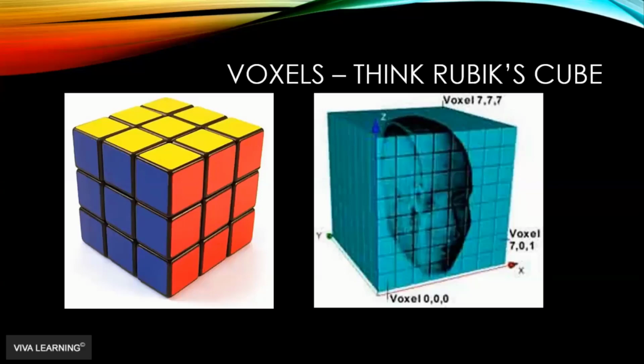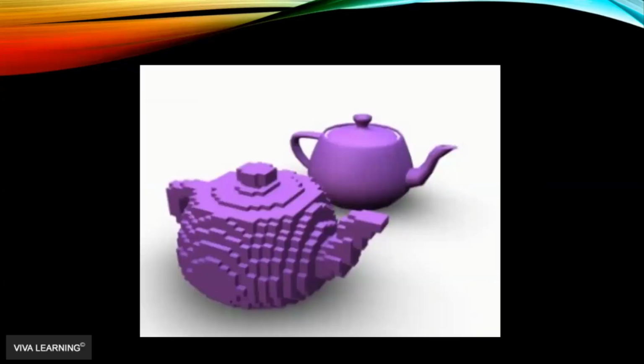And so when we see the CBCT volume, it's a compilation of all of these different cubes, which in turn relates to what we call the attenuation coefficient of the tissues. So in other words, how do the tissues attenuate the X-ray beam, or how dense they are? So voxels are important when we think about the resolution in the scan. The number and the size are very, very important.